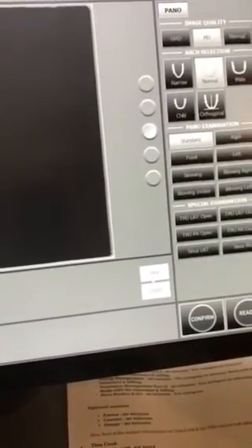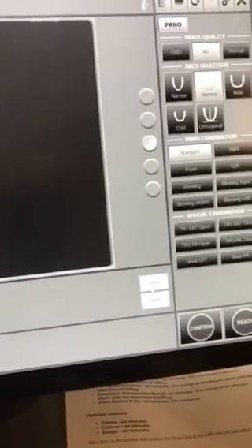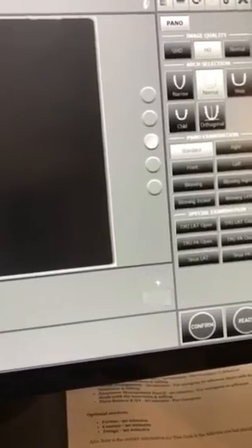So once you've picked the one you want, come down here and you're going to see a save and a cancel button. If you hit cancel, you will lose the pan. So you want to hit save, and it is going to go back and it's going to put the image back into the Curve software. Brings up this question asking you what you want to do with that pan. You want to click done, and now the pan is in that patient's chart. And that's how it's done.